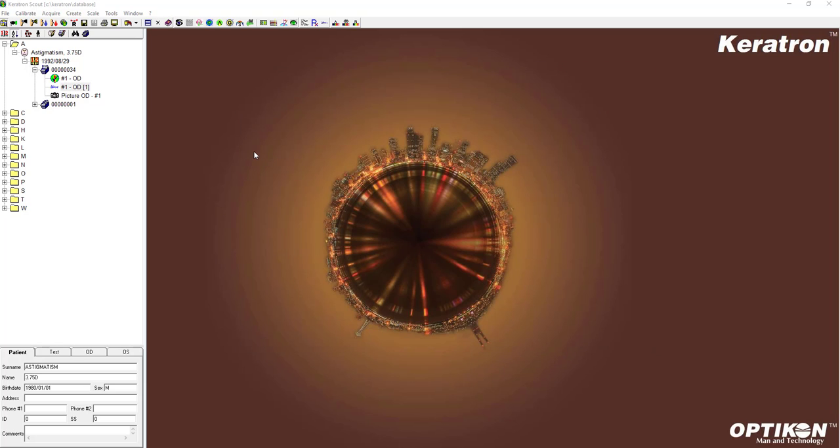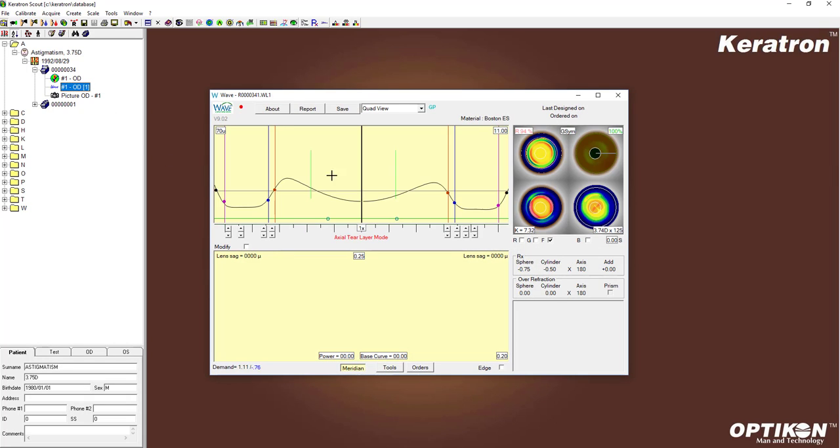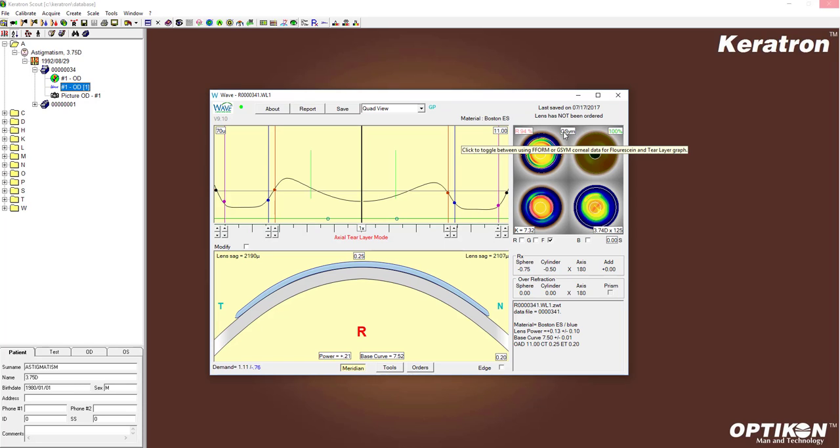Now, whenever you open up to do a new wave design, or look at another wave design that's already built, when you open up that window, the toggle switch is going to stay at GSYM. Okay, so you need to think about what you want to design in for that tear layer view.